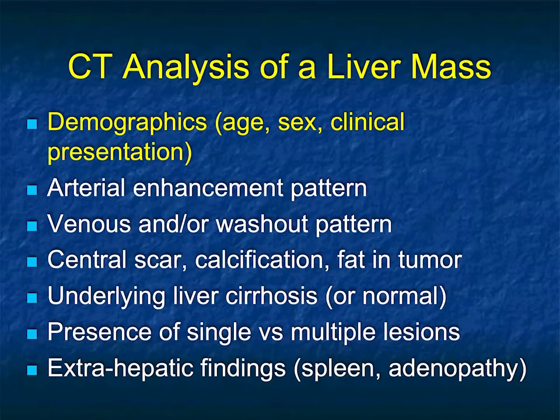But in routine imaging, we do not do non-contrast scans. We'll typically do a dual phase acquisition, arterial phase at about 30 seconds, and venous more like 70 seconds. Occasionally, we will get delayed scans, typically at 4 to 5 minutes later, but most of the time we're doing 2 phases.